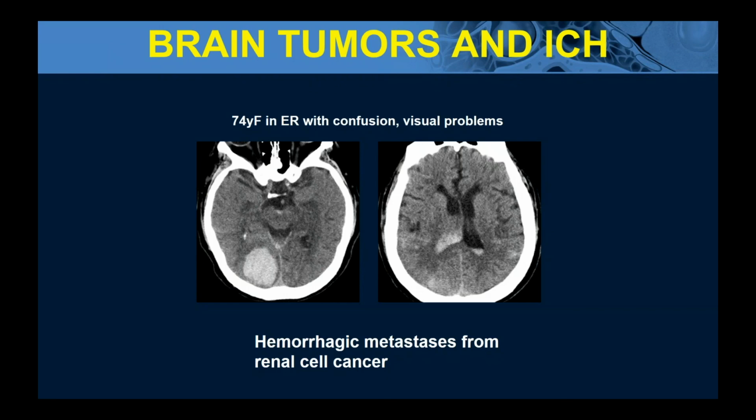We get about a half a dozen of these on a normal basis in a night. And this particular one shows brain bleed, high density white blood clot. It also dissected into the ventricles, and we see a couple of other little subarachnoid hemorrhages there.